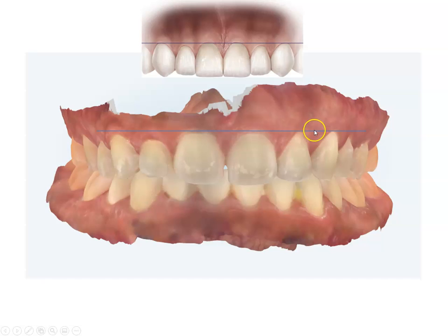And in this case, we already have the tooth at this position. Here's an overview of how it should look. And here you can see that slightly things need to be adjusted. Maybe this one brought in a little bit, or maybe this one brought in slowly, but you'll see when we do the analysis that it's important to create as ideal as possible, acceptable or ideal position.